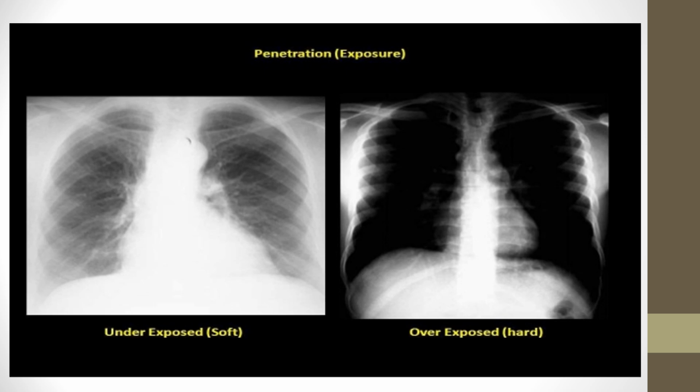The penetration was too far, and that's why things that could normally show up, there could be a coin lesion here for all we know, but because it shot so far through, we don't know, right? Normally it would show up, but it's not showing up here, so we could miss some important things, and that's why the exposure is a pretty important thing to look at. So if we're looking for something that needs that exposure, we need to make sure we got the right exposure.